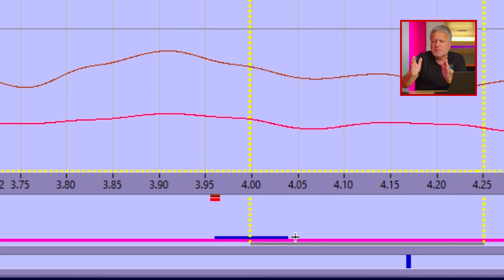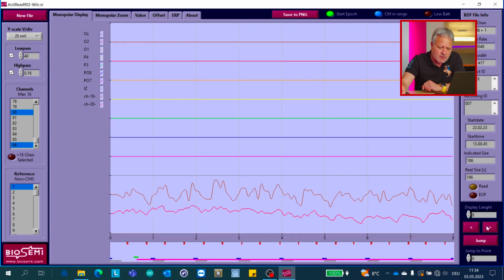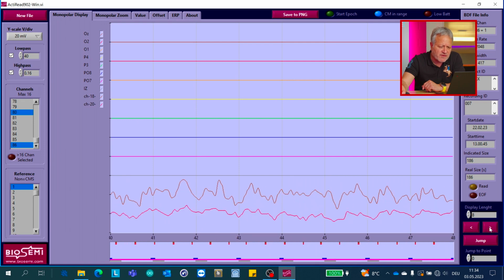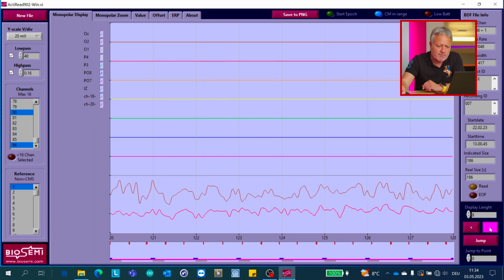So if it's a little bit less sample rate, it's okay because we're in the middle, so we can shift a little bit to the right or to the left. If it's longer than 13 Hertz, 14, 15 Hertz, we're in the middle, nothing can happen. We actually always sync on those second markers. That's it. There's not much more I can say about this. So it's clear that when we run through the whole acquisition, nothing changes in terms of those triggers at the bottom.